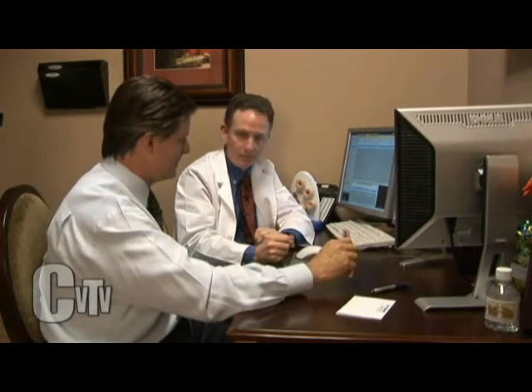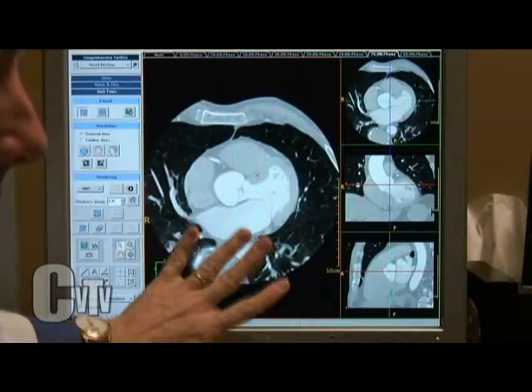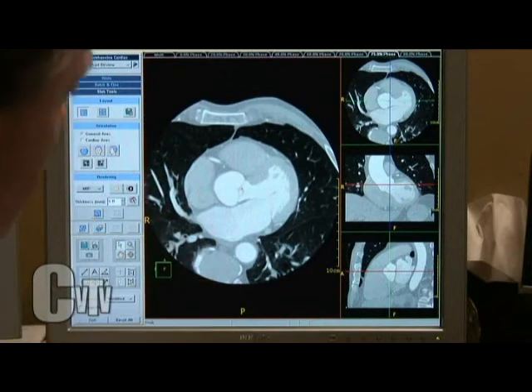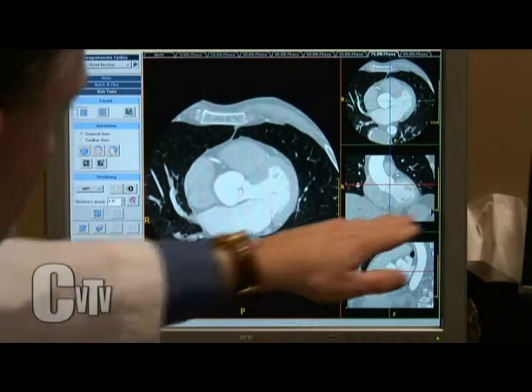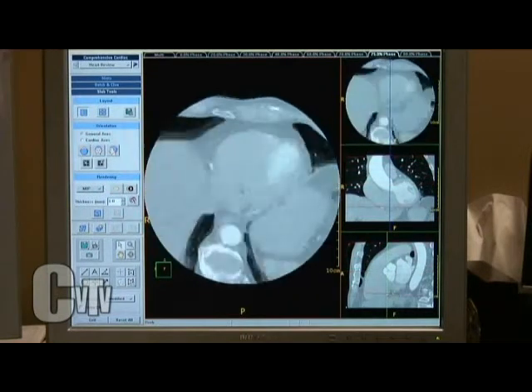This is what we're going to see from that. As we take all those slices, we can then reconstruct this data. This is the raw data we look at first. Let me just orient you to what is on these pictures. This image here is the same data set, but now arrayed slightly differently. This is your heart in the middle. I call this the chest x-ray view. The heart in the middle. This is right lung. This is left lung. Down here would be your stomach, and there's your liver. The red bar shown here is actually that individual slice taken at that level. So I can go to the top of that slice here, or I can go to the bottom.